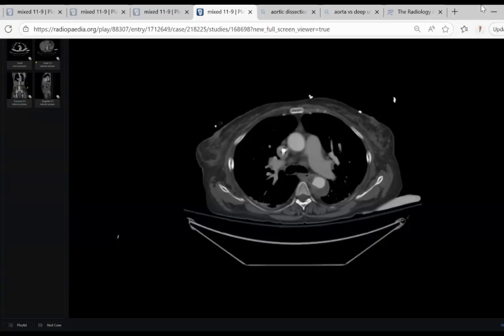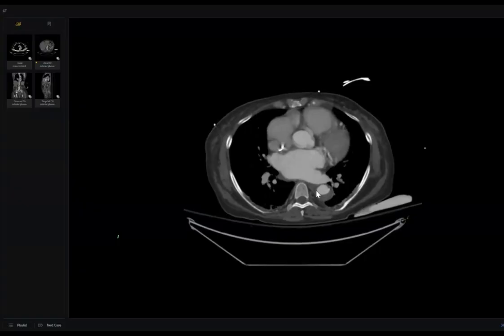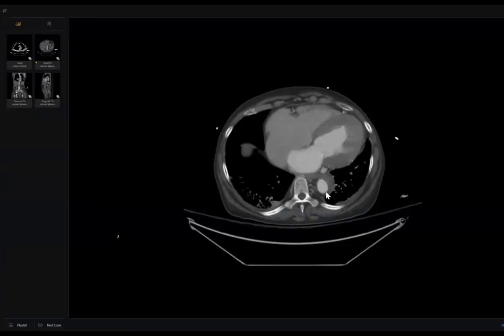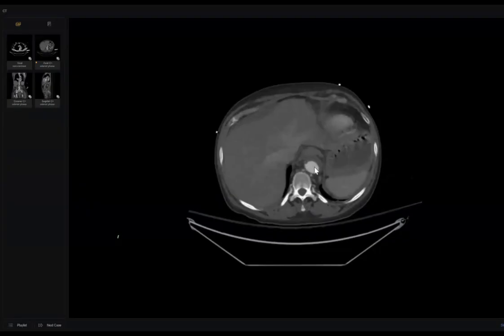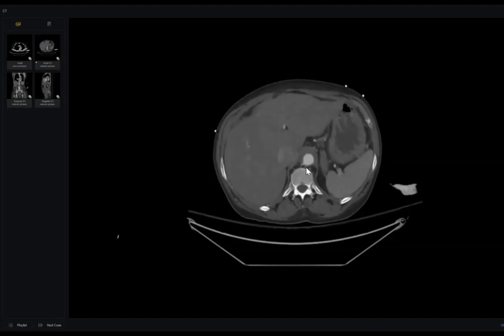I will give you one very important tip here. Here, the thickening starts posteriorly, okay? And then goes down, down, down. It starts to be left lateral and anterior, and more anterior. See, completely anterior. This is not logical with atherosclerosis, especially as the inner border is very smooth in the whole length. See, complete anterior thickening.